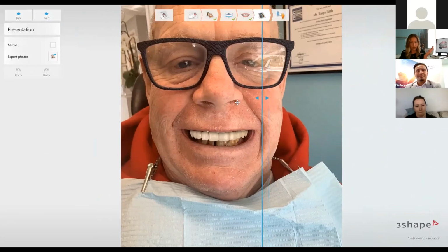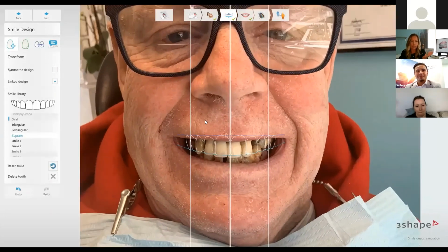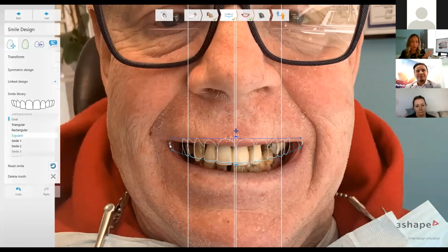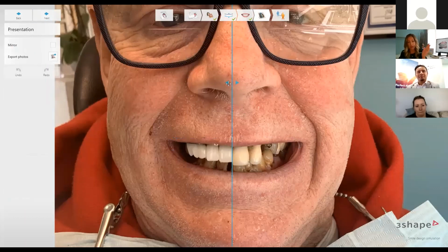Okay, he's got a big smile. These are big chompers. Don't like it? Go back and he might say, "Ooh, wow, yeah, that's a little toothy." No, you've been missing teeth for a while. So no problem. Let's go in, working within the parameters of what the anatomy will allow us, and we can reduce it. Maybe it's too much for him. Let's see how this looks.